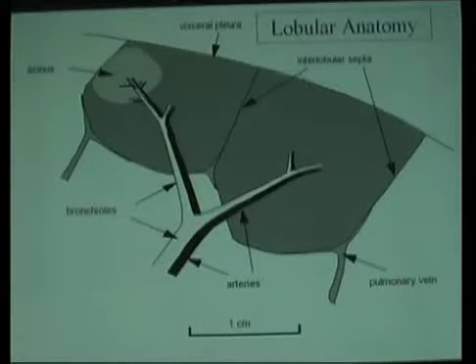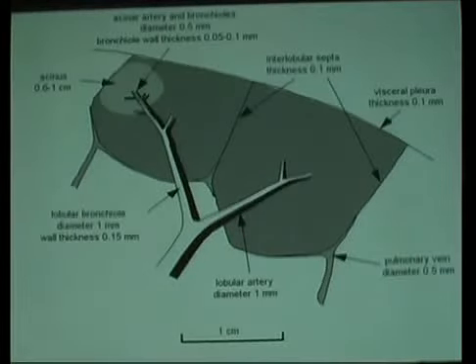When these things are up against the pleural surface like this, these tend to have right angle configurations. If they're in the middle of the lung, they can be hexagonal or polygonal in shape. Okay? So we talk about centrilobular distribution of pathology, and we talk about perilymphatic distribution, and I'll show you a million images in a second. But what we're talking about is the fact that there are some diseases that clearly center in and around the secondary lobular core, and there are some diseases that like to live along the edges of the secondary lobule.